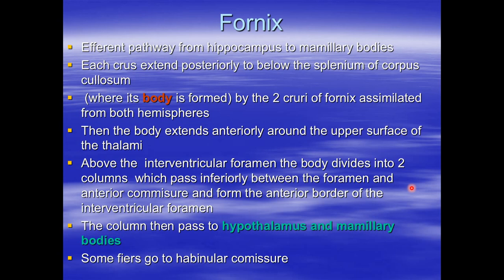It's composed of two crura extending posteriorly to the level below the splenium of the corpus callosum, and they unite to each other.